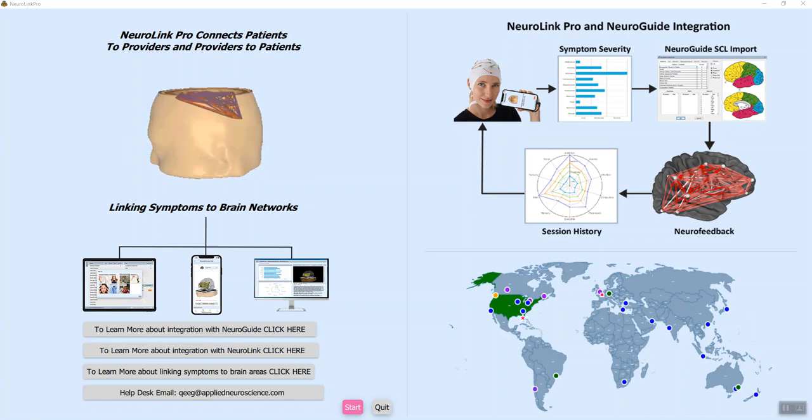This is a video on a new product called NeuroLink and NeuroLink Pro. On the right-hand side of this screen is an overview of what NeuroLink Pro is and how it integrates with NeuroGuide. The goal of NeuroLink Pro and NeuroLink in general is to link patient symptoms to patients' brains.